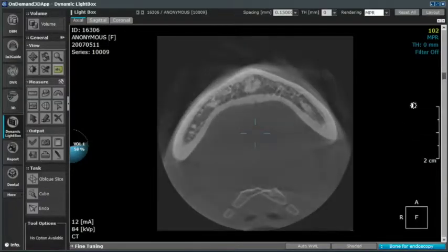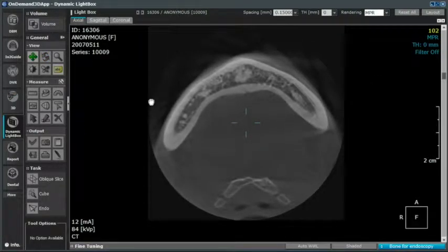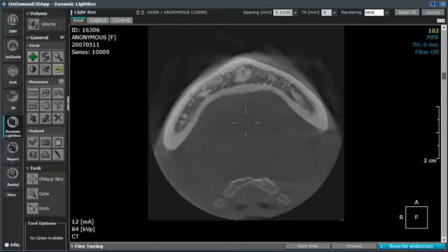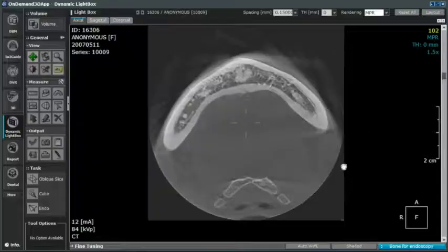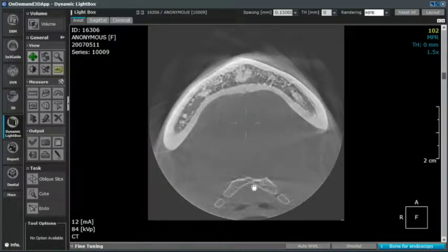What you're going to see first of all is axial slice data that I scroll through. With my right click, I can window and level. I can change brightness and contrast. You get used to this. Everything happens on the mouse. You don't have to pick up a tool all the time. It's just fantastic. I can filter it, put on a sharpening filter. It looks a little clearer. Make it a little clearer still for you. See how the detail came out there? And now I'm just doing a little bit so you can all see it, okay?